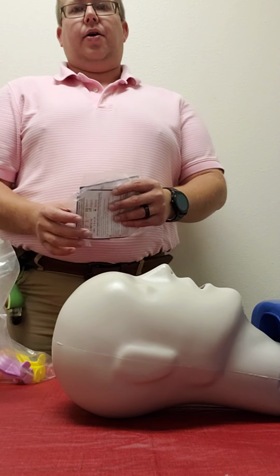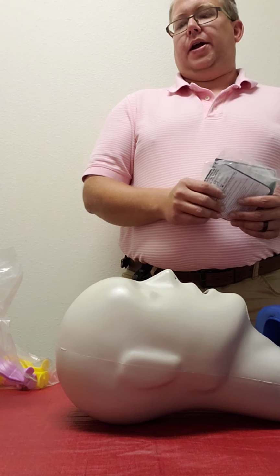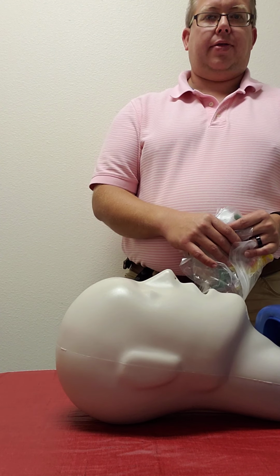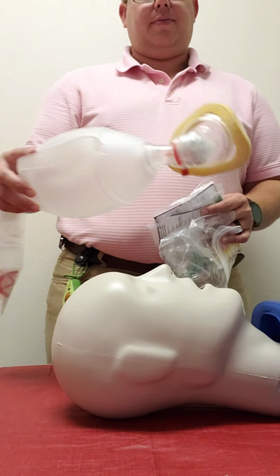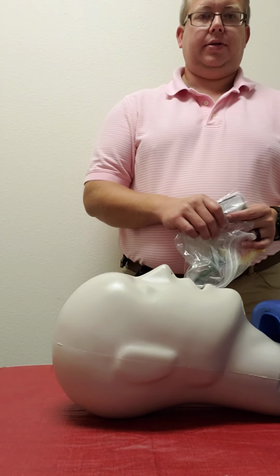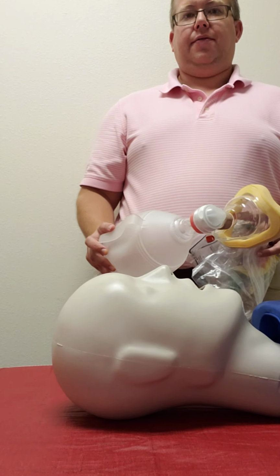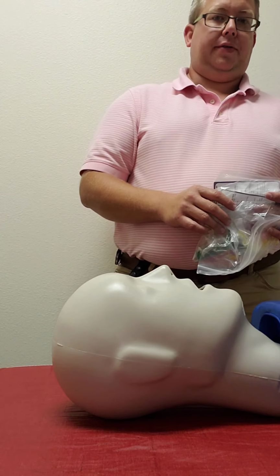Okay, so now we are moving on to the next level of airway. That level of airway is now going to be your first airway adjunct. To recap, we started with mask to mouth, and then we went on to bag valve mask, and now we're going on to an airway adjunct because bag valve mask, while great, does not give you a definitive airway. You need a more definitive airway if your patient has not started breathing on their own.